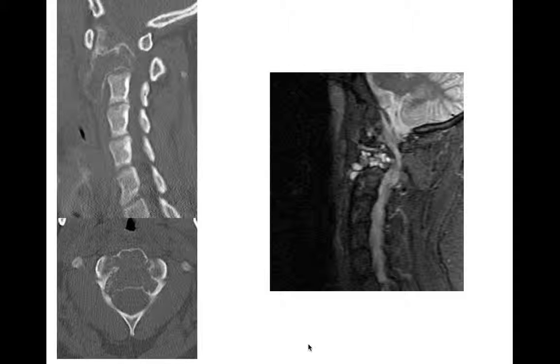All right, we're going to move on to lesions that occur in the spine and the vertebral bodies that are not ivory in this case. These are really all expansile lytic lesions of some degree. And there's a short differential of common things that are going to do it. This is not an exhaustive list I'm going to give you, but just common things to think of, which are more likely to be right than wrong.